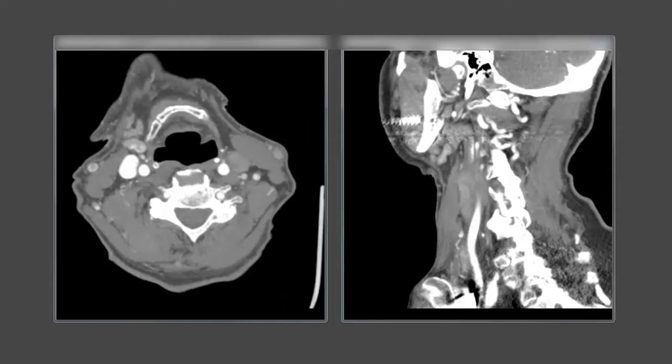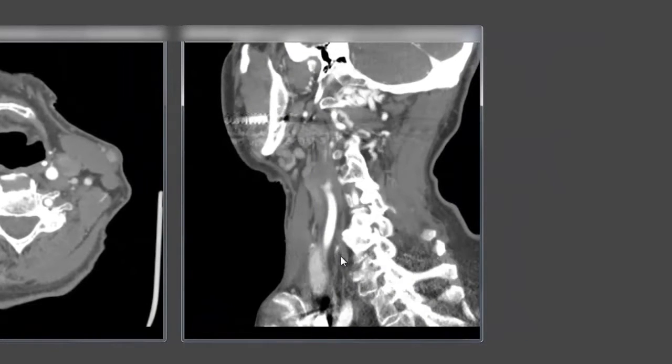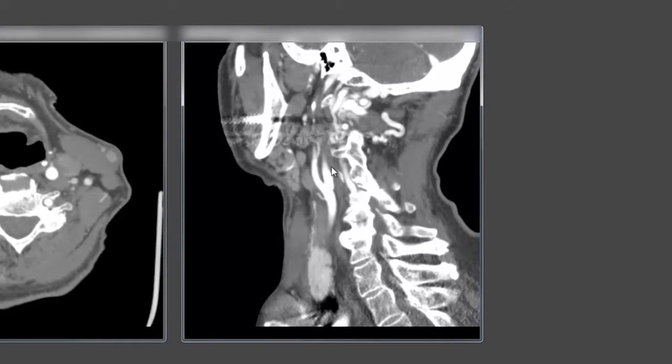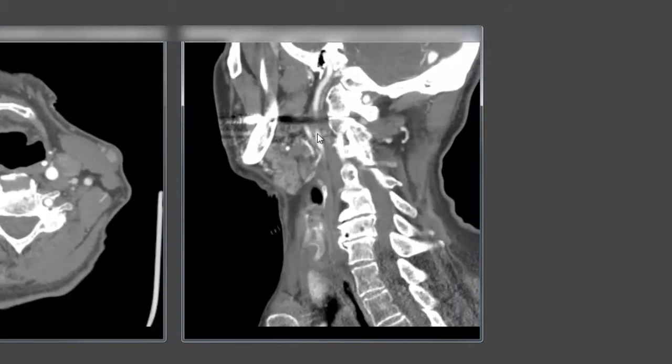Okay, we've determined that there's a large artery occlusion in the left MCA. Now we need to look down in the neck and get a sense of the anatomy there to determine our flight path up to the large artery occlusion intracranially. So here we have our source images on the left, and we have our reconstruction of the carotid on the right. Looking at the thick MIP reconstruction, get a good sense of the overall landscape. The common carotid, the carotid bifurcation in the neck, there's a very small area of narrowing there, but nothing too bad. A little bit of narrowing here, but again, there's no significant stenosis and no occlusion of the internal carotid in the neck all the way up to the skull base.